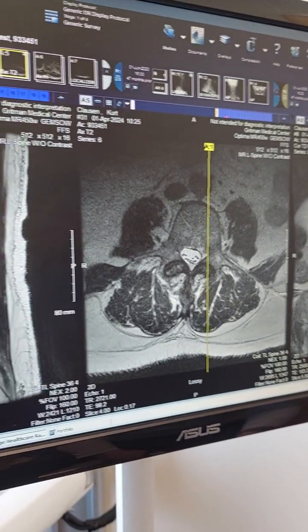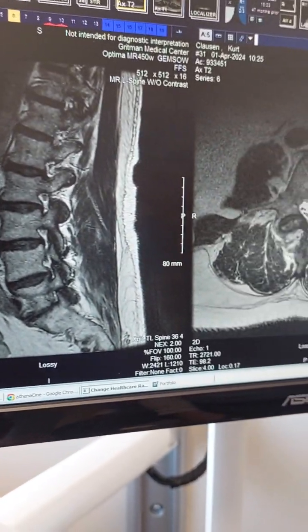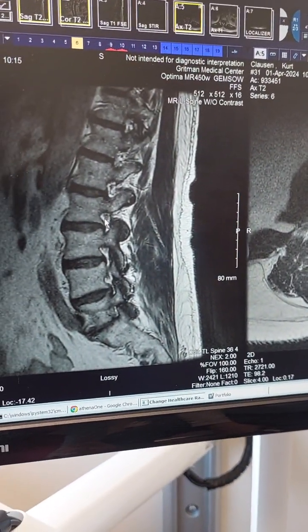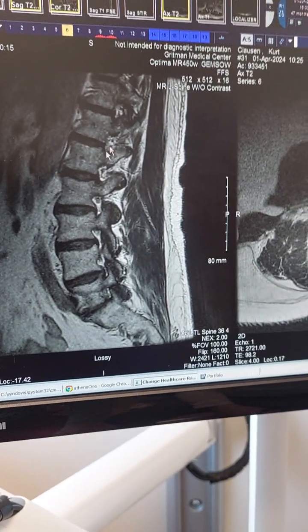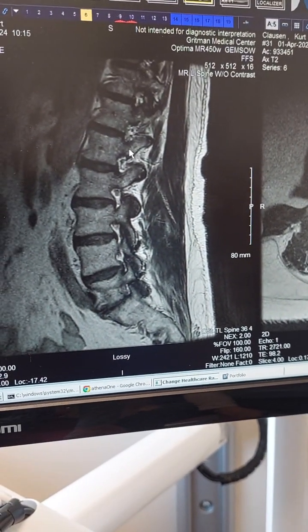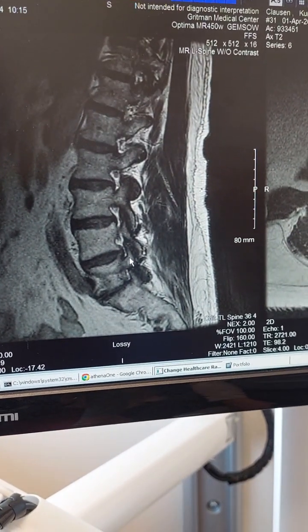So this is now that paper-thin slice, going through more on the left-hand side. And we're looking at these openings right here. These are the foraminal openings where the nerves exit, the black dots. Those are the nerves exiting out through the foraminal openings. Do you see how wide open these are up here? They look more like a jelly bean, and then we get down here, and now they look like a little keyhole.